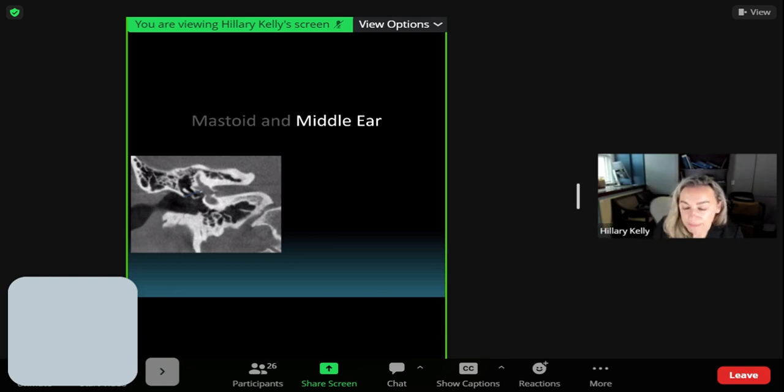If you draw a line at the tympanic segment of the facial nerve canal, which we'll talk about in a minute, that is effectively the line between the epitympanum and the mesotympanum. And if you draw a line from the tympanic annulus here, below that is the hypotympanum.